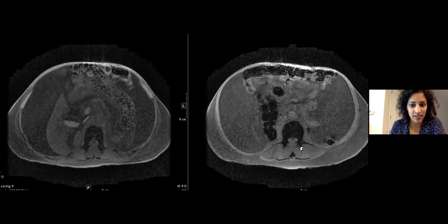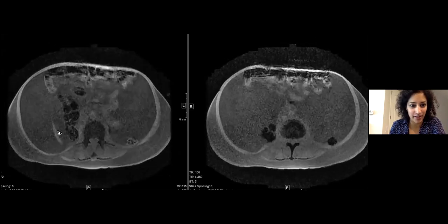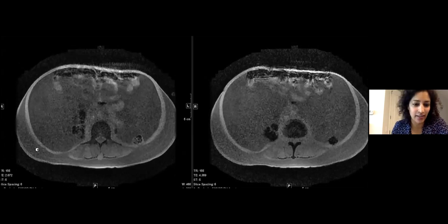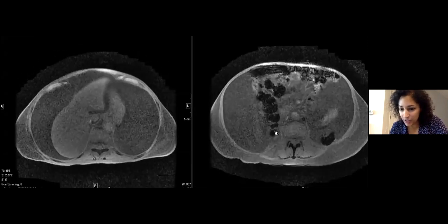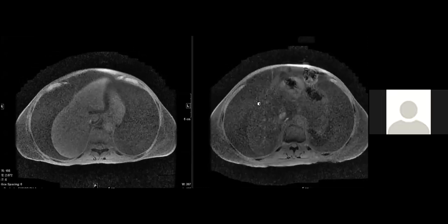So I'm thinking, as long as the TE is right, that the in phase, later echoes, is on the right because the air is blooming more over there. And I'm wondering if the ascites and the anasarca is making it so you're not able to see the fat interfaces. Right. Gitanjali is also asking, is the fat sat on? So there's no fat sat, but good question.